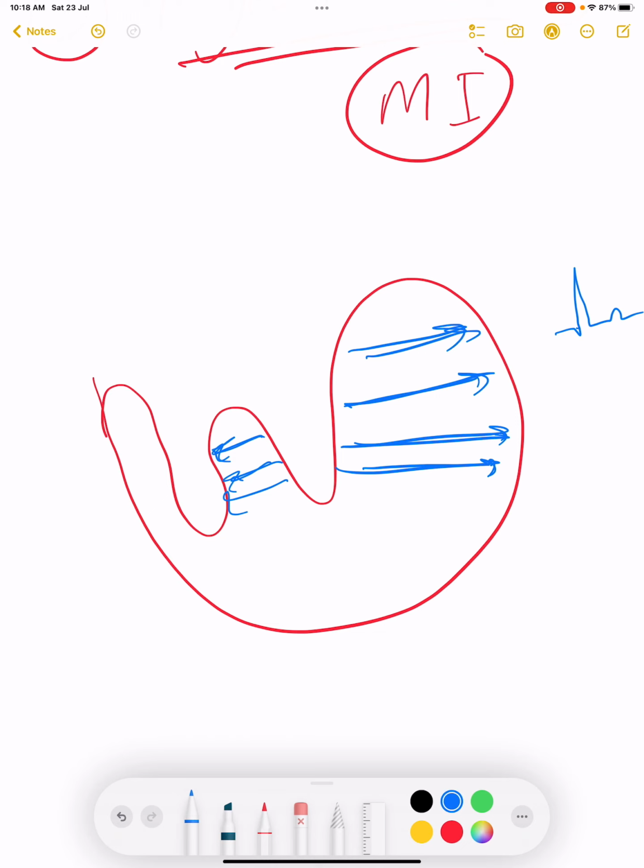So there was usually a very small insignificant Q wave. Similarly, in inferior leads there was no Q wave, because first it was perpendicular to that, and second the vector is very big and was just cancelling out the Q wave negative deflection. So there was no Q wave or a very small Q wave in the lateral leads.